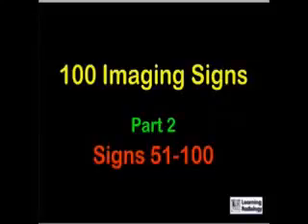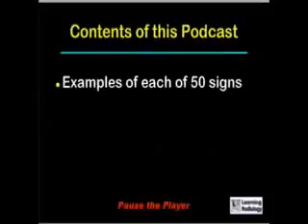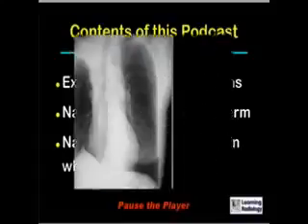Signs Part 2, Signs 51 through 100. Hello, I'm William Herring from Albert Einstein Medical Center in Philadelphia. In this podcast, we're going to see examples of each of 50 imaging signs. We'll name the sign or descriptive term and name at least one disease in which the finding occurs. This is an interactive exercise, so make sure to pause your computer or MP3 player if you wish to take more time. Here's the first sign.